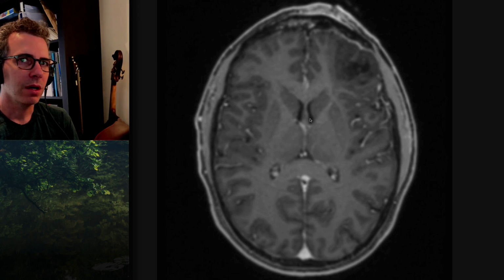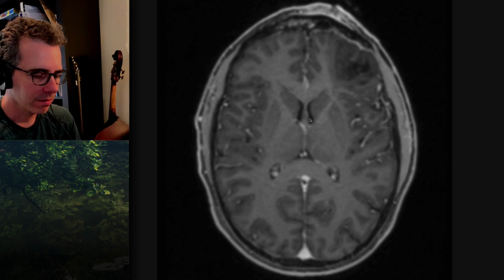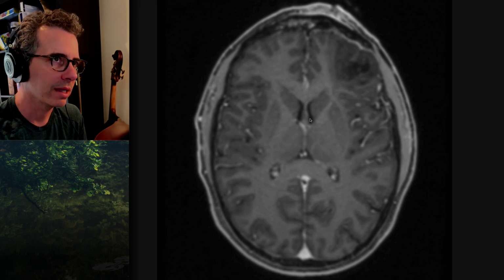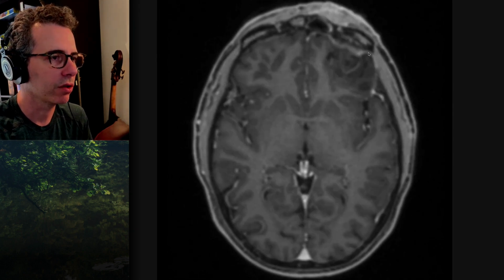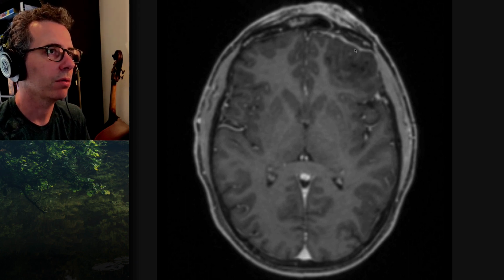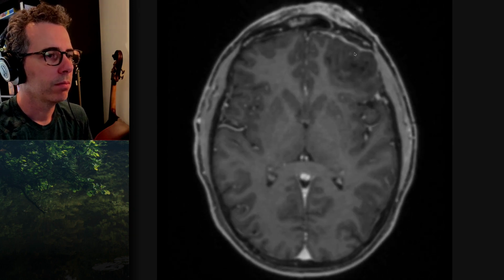So if you fracture the bone, the underlying periosteum, which we covered last time with the parietal layer of the dura is periosteum. If you fracture bone, you expect the periosteum to be inflamed, right? So you're going to always have pachymeningeal enhancement over the top of a fracture that's bad enough to have stripped some of the periosteum off the bone to introduce air between the periosteum and the bone, which is where that gas is. Yep. And now we'll look at diffusion restriction.